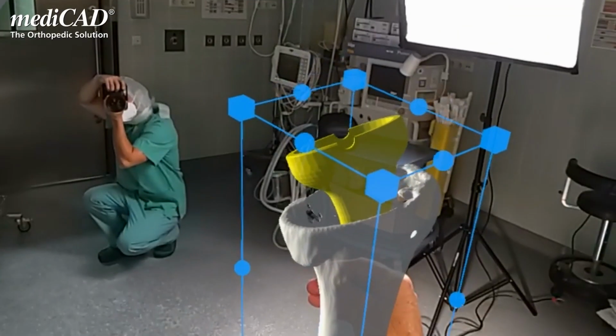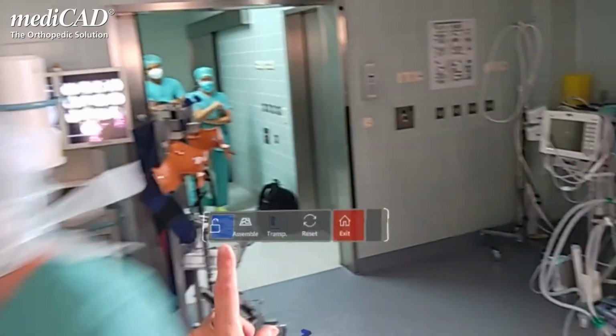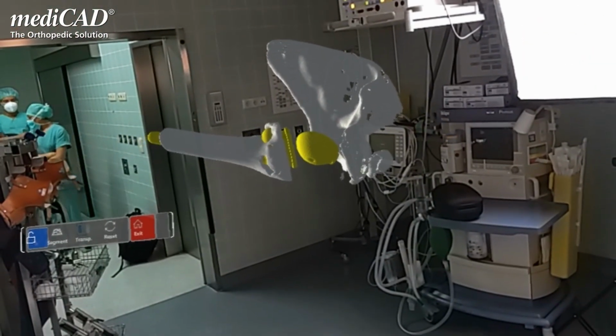These are huge planning advantages. This is actually also a time advantage intraoperatively, as well as the benefit that I can save trays, in addition to the advantage of saving instruments because I know exactly what to put where. Planning, patient safety, quality of care.